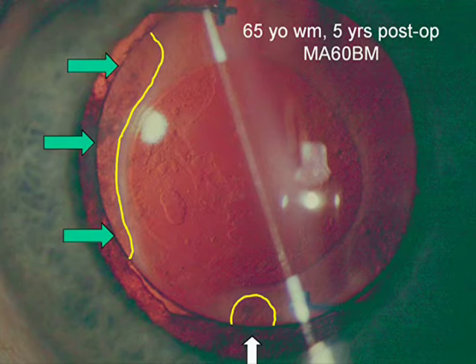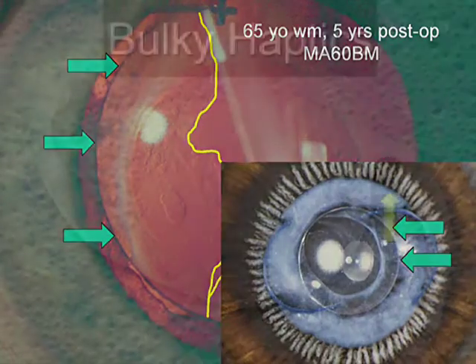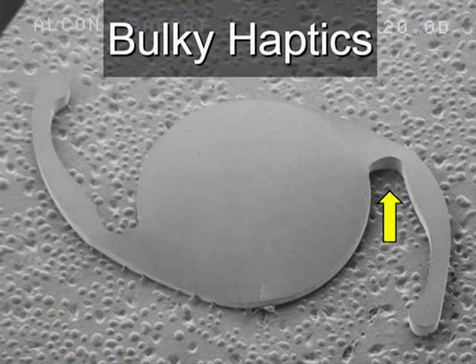fibrosis. Perhaps it is best to think of this patient from the Miyake apple perspective. We see here a good correlation for the increased areas of capsular lucency as outlined by the green arrows. For this patient, Sommering's ring is not an arcane perspective, but the process that resulted in posterior capsule opacification and loss of visual acuity.